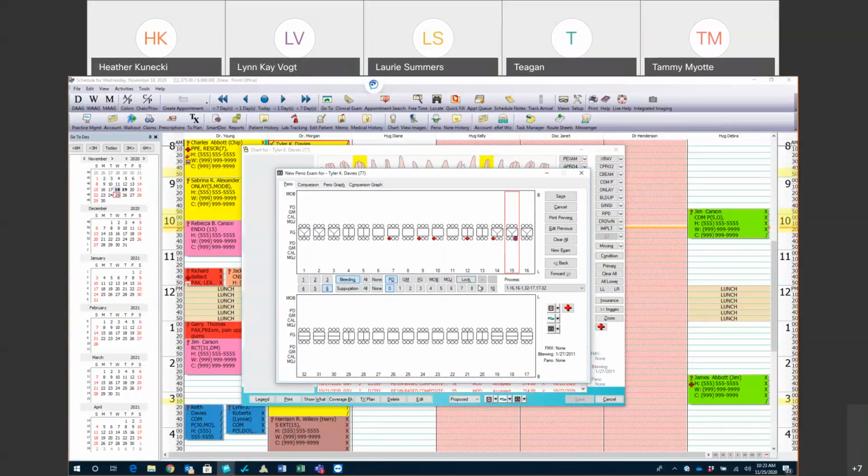You know it's locked because it's highlighted in blue. I don't know if you can tell from your screen, but you can see the buttons that I'm using are this little blue color, and next to it, if I uncheck it, it turns back to that gray.